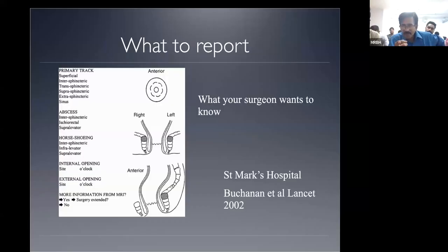How to make out which side anal gland is the primary site? It can be difficult, Makunda, you are right. But the point is that what you need to identify is your primary tract. Your primary tract is the widest, the one with the most fibrosis. So on T1 weighted imaging, you're going to see a black line.